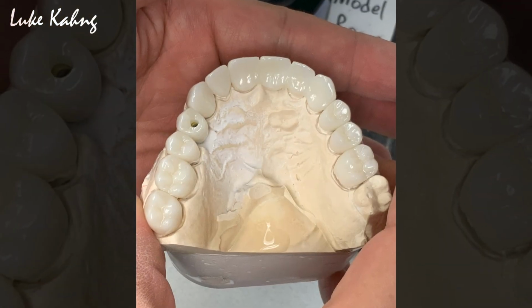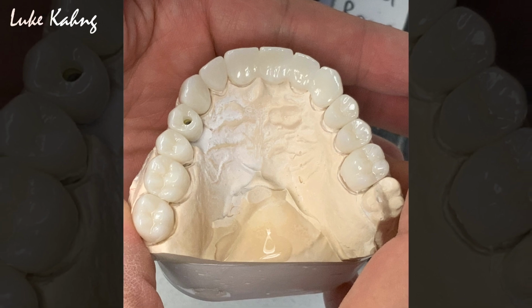Kind of a little bit bold, but it's a really, really important message for you guys. People constantly make a mistake, especially technicians. So technicians have to know the design part. A lot of people make the design and then finish it. They look good, but it's not right, because I'm talking about the function. I'm not really talking about the aesthetic at that moment.